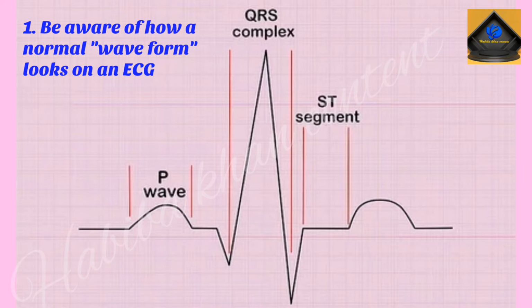The ST segment directly follows the tall QRS complex. It is actually the flat area prior to the next semicircular shape on the ECG, which is the T wave. The importance of this flat segment, the ST segment located right after the QRS complex, is that it provides important information to physicians about things such as potential heart attacks.